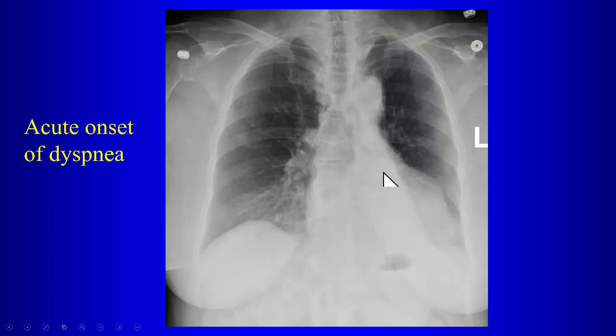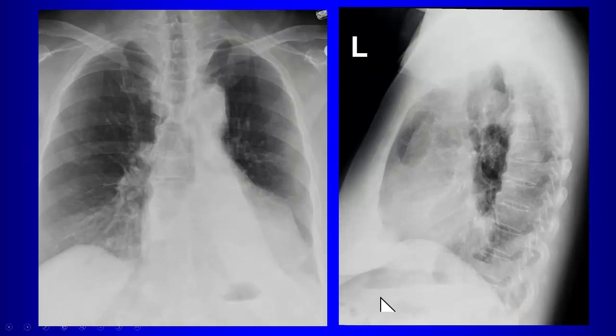So we have this wedge-shaped retrocardiac opacity that obscures the left diaphragm. You have a double density there. Heart looks like maybe shifted a little bit towards the left, but this is left lower lobe atelectasis. And then again, your lateral view, you notice what?